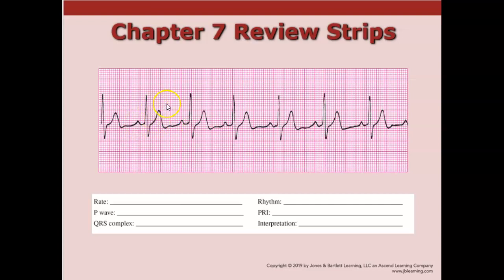And then we look at our QRS. Our QRS is going to be 1 to, looks like maybe 2 boxes at the most, so 0.08. So that looks to be all within standards.